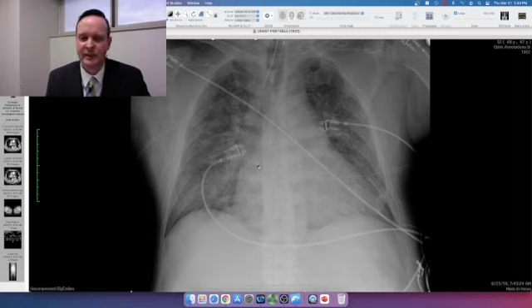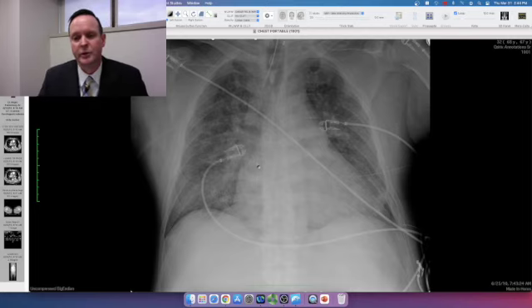Those are the 5 findings that I look for in cardiogenic pulmonary edema. But here I want you to remember the combination of consolidation and interstitial thickening is very characteristic of pulmonary edema. And in this clinical setting, that would be my leading differential. Atypical infection could have this appearance.